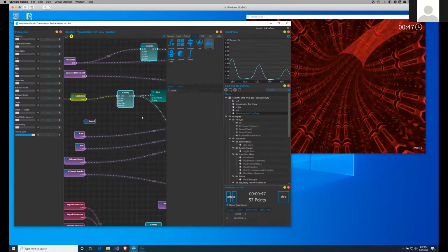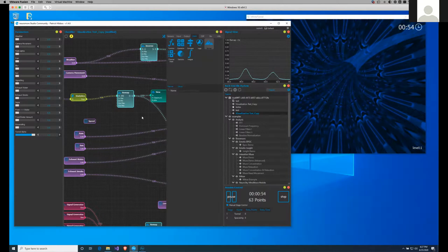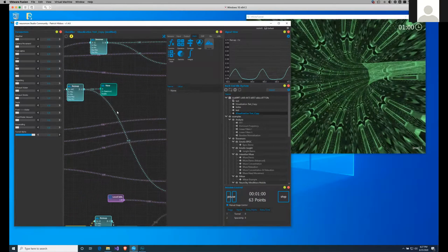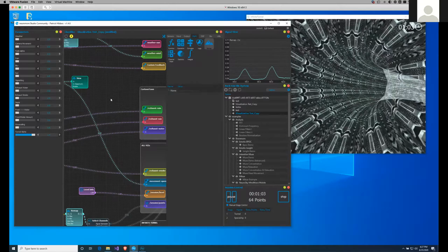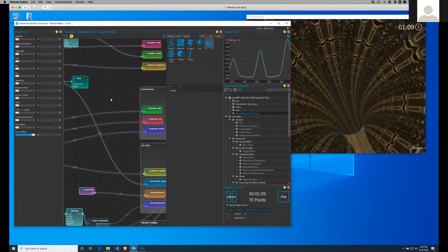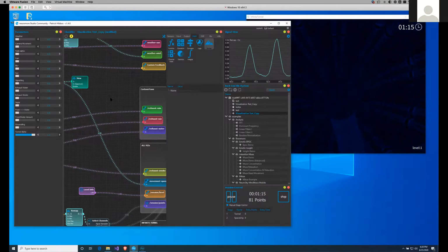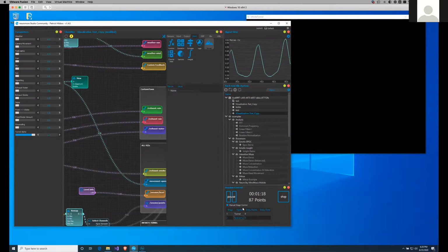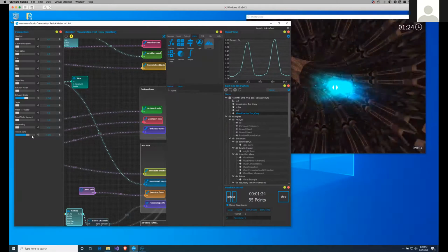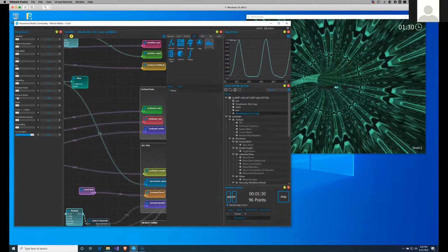And like we already covered in previous Q&A sessions, of course, you can go as crazy as you want. You can do whatever calculations you want to do. You can connect different channels to different modalities. You can come up with whatever algorithms or formulas that determine the speed. I could also map the delta amplitude to the color. We can get in the spaceship and say, oh, we also want to control the exhaust and so on. So the sky's the limit. You can unleash your creative powers and do whatever you want to do with it.